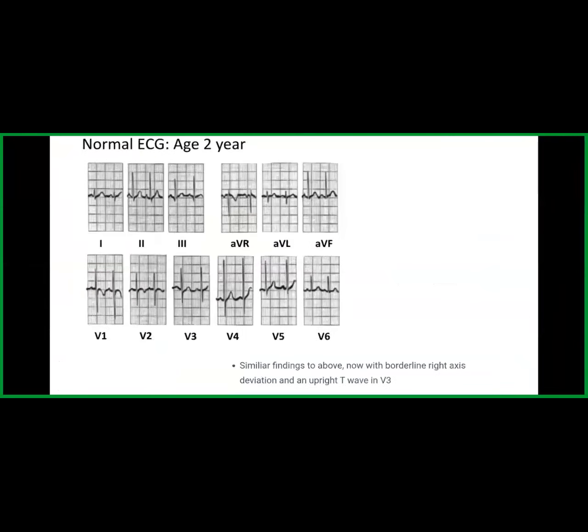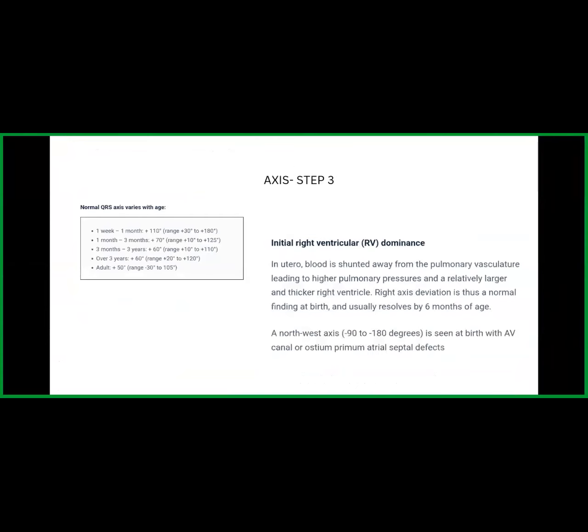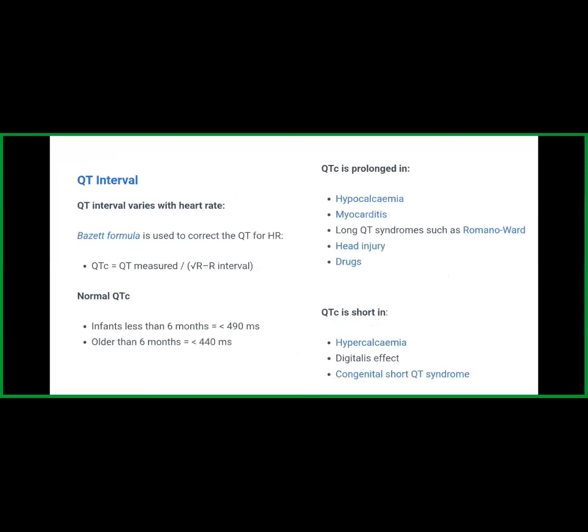So there is right ventricular hypertrophy, but it is not the one we want to discuss in detail, or this right ventricular hypertrophy is not abnormal as per age. So abnormal Q waves in V1, abnormal T waves in V1, and abnormal RS ratio in V1 and V6 should highlight that right ventricular hypertrophy is present in this patient as per their age.